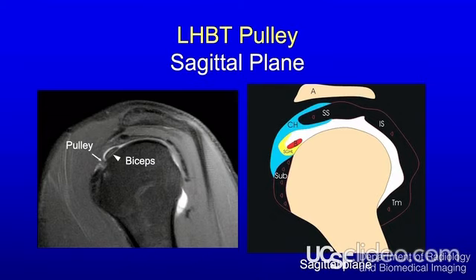If it's not high signal, then that is just part of the biceps. It has this little cleavage in it. And notice how the biceps is higher than the subscapularis tendon where it forms a comma on the lesser tuberosity attachment there. We'll see how when you get problems with the pulley, it actually displaces inferiorly and it gets close to the subscapularis. So this is a normal appearance.